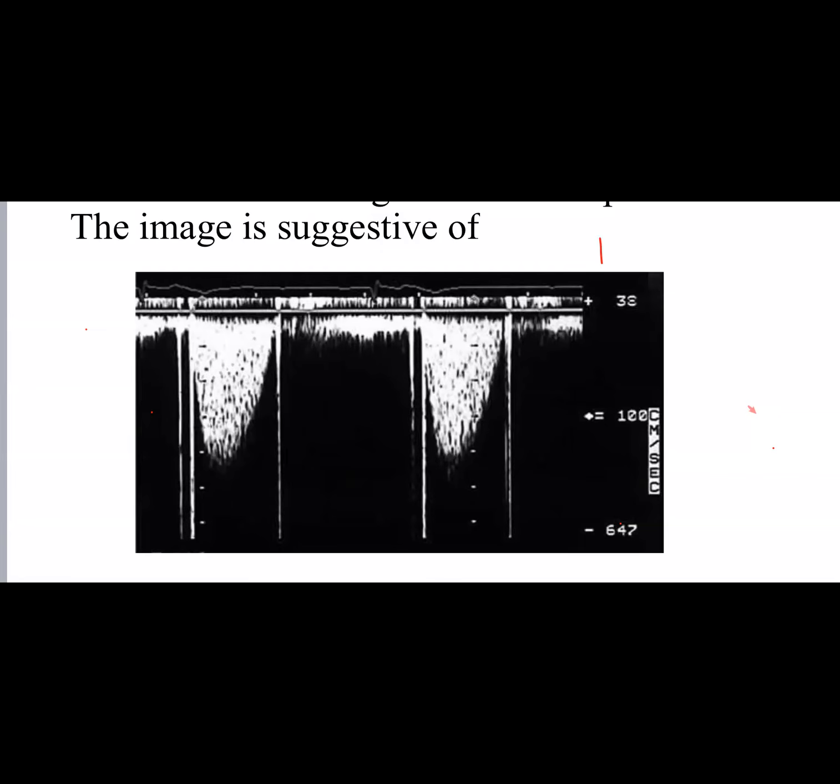First of all, tell me, is this patient having any prosthetic valve or no? Yes, there is a prosthetic valve. Exactly. I have precisely a metallic valve because it imposes these metallic flaps you see in the opening and closing.